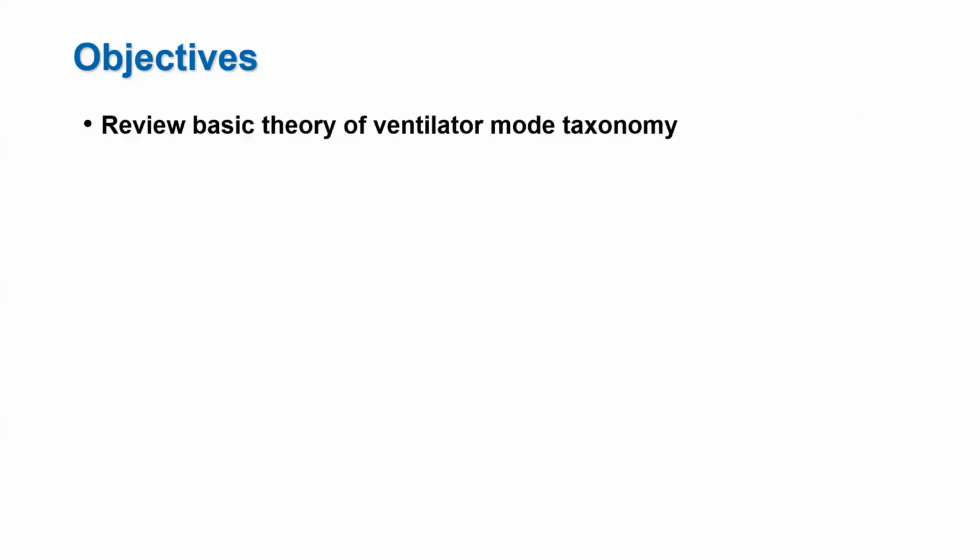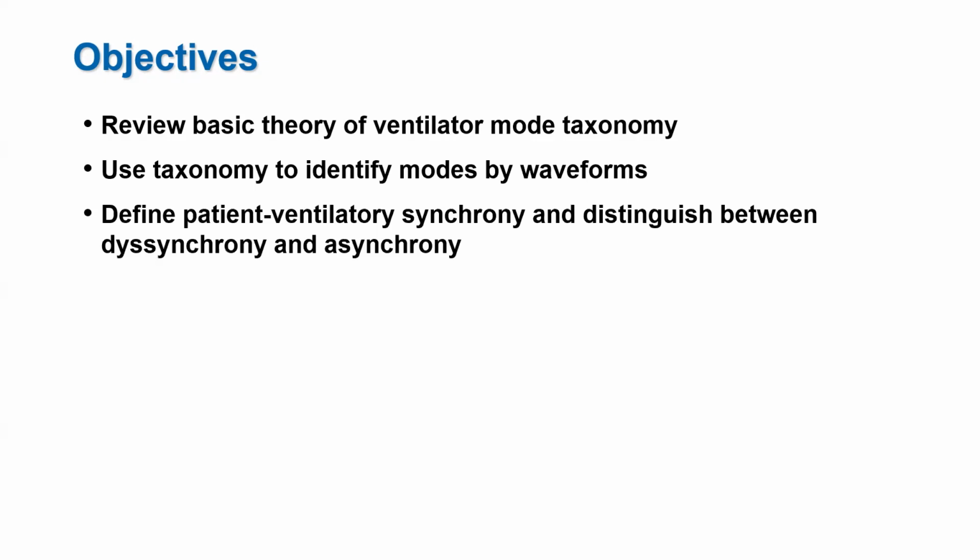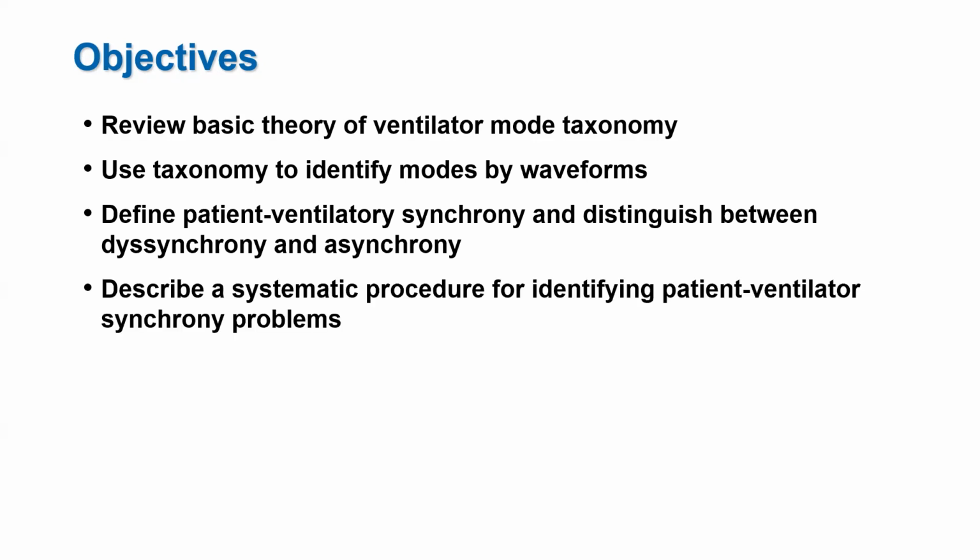All right, in this lecture, we will start with a review of the mode taxonomy. And if you were around for my previous lecture, you know what I'm talking about. But if you're new, we'll go over some of that. This will lead to the use of the taxonomy to identify modes simply by examining the ventilator waveforms. Next, we define the different types of patient-ventilator interactions and synchrony problems. And finally, we will practice a standardized 4-step procedure for interpreting waveforms at the bedside.